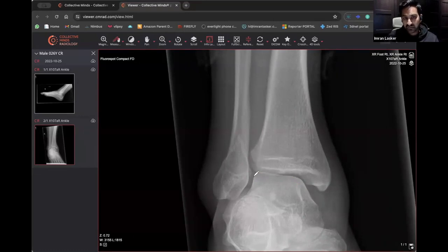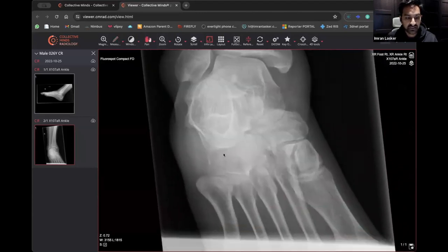And there are gradings of osteochondral defect. Generally speaking, the most likely place you'd get one is in the supramedial talar dome, so that's medial, next to the medial malleolus. But this one doesn't seem to have anything like that. In truth, the next place I want to look at is the base of fifth, because so often you have a base of fifth fracture that you just won't see because you're looking at the ankle. And then again, have a look at everything else. Everything else looks okay. I haven't seen anything grossly abnormal.